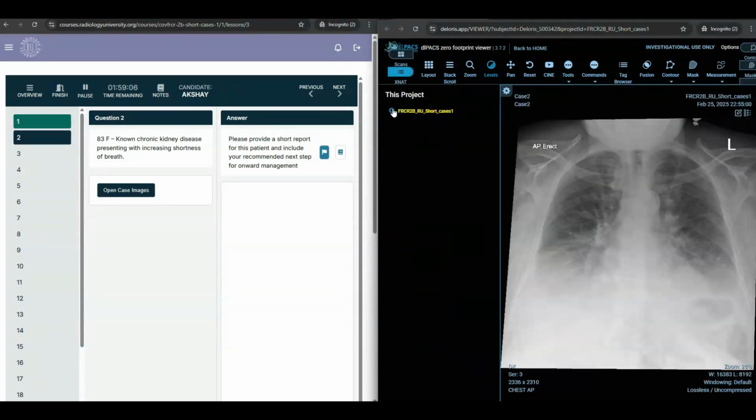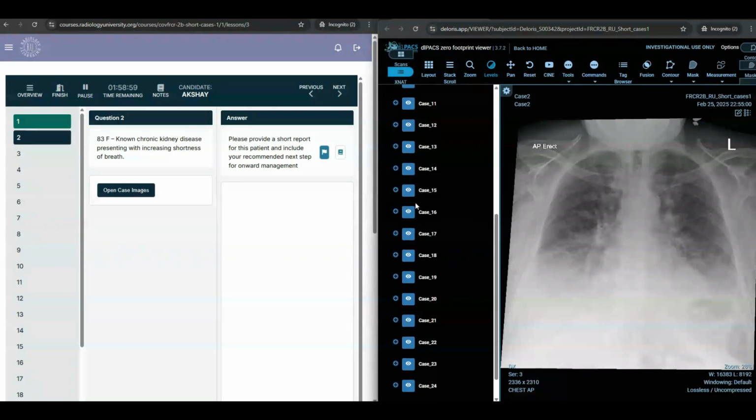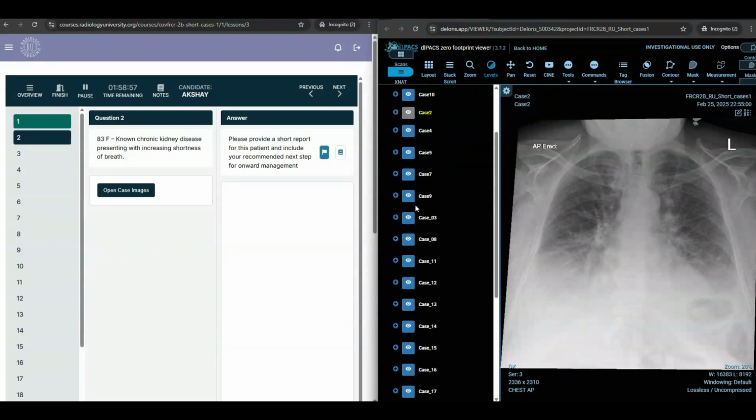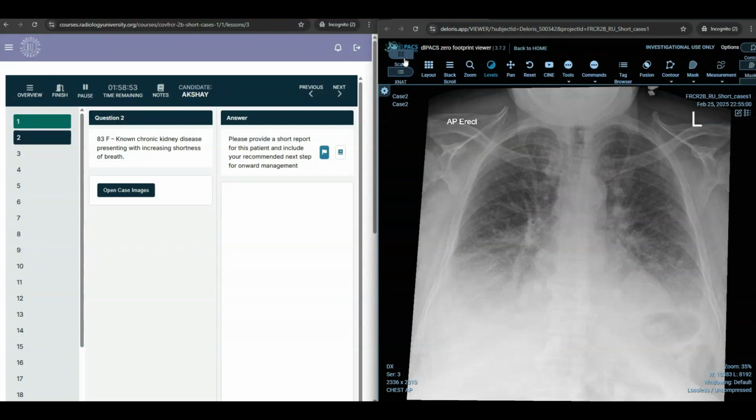If you want to do it easier, you can go to this next button and click on the next pages. They're not in order, somewhat in the beginning, but you can do that if you want, or you can just rely on this button to know.